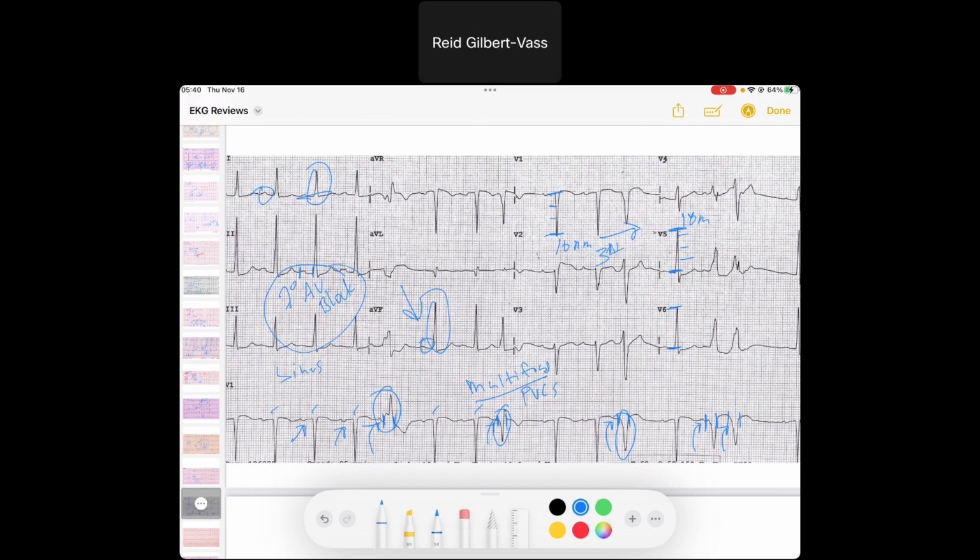34 millimeters, so borderline, but not quite left ventricular hypertrophy. Around the board, I'm sure there are other criteria. Yeah. At the end of the day, this is just electrocardiographic evidence, and so borderline LVH.